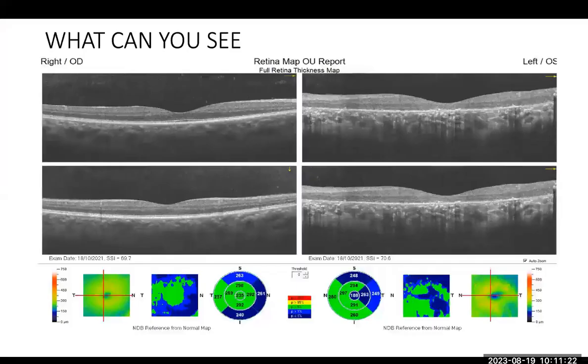Yes, this one. All right, so I want the doctor to, if you can, enlarge this image on your own screen. Now, move to the picture on the left and see if you can identify the nerve fiber layer.